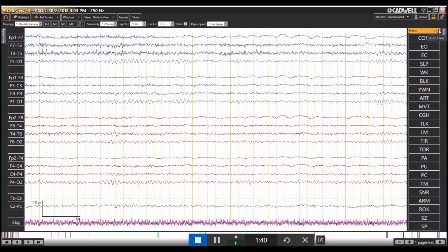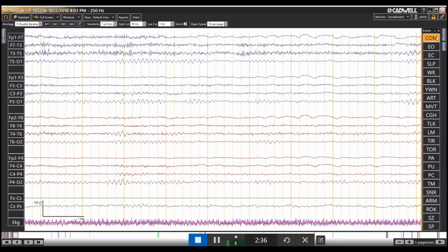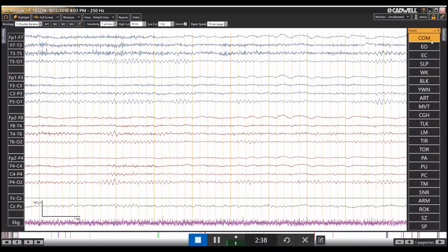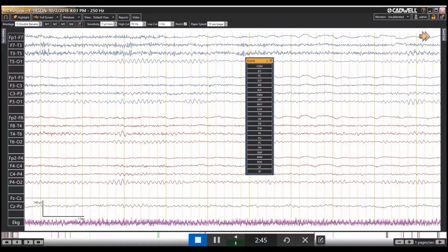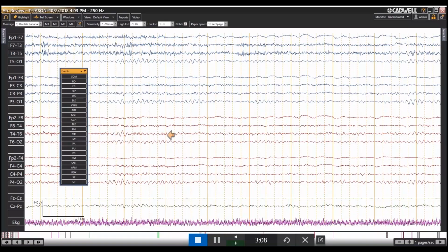There's the auto hide, which means pinning to the side of the screen. There's also the float, and we'll come back to that. You'll also notice that I have a 10-second screen, and if I hover, it covers that last half a second. But if I dock it, it adjusts the screen so that it still shows the full 10 seconds. Now, one of my other options is to float the window, and you'll notice that if I float the window, now it does cover the EEG, whereas with docking, the window adjusted so that no EEG was covered.